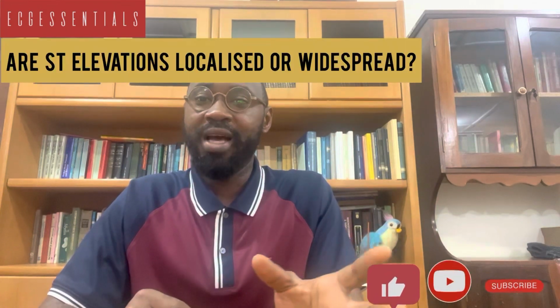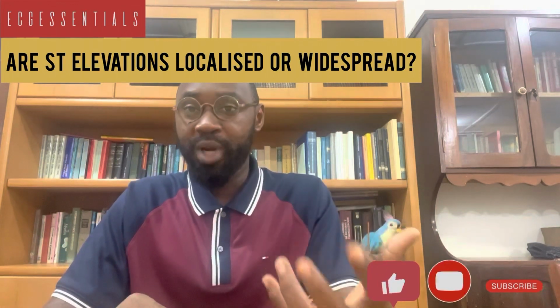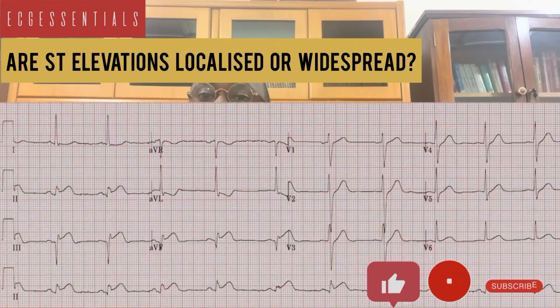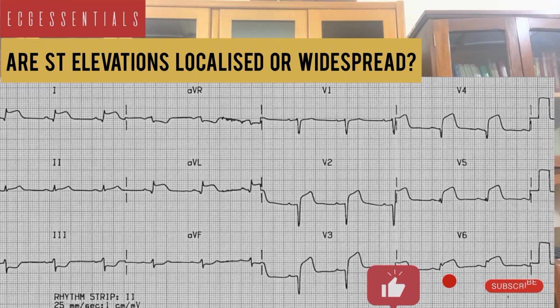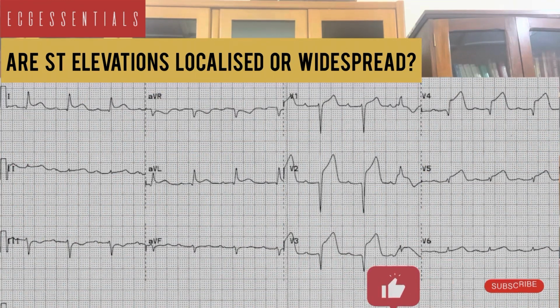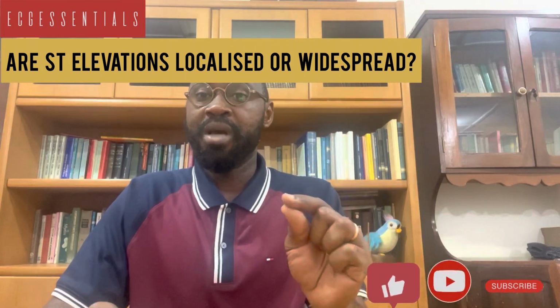All right. So we should also be looking out for whether the ST elevation is localized or is widespread. When I say localized, I'm referring to whether we find these ST elevations in the inferior leads, in the left lateral leads, or in the anterior or septal leads, because ST elevations representing myocardial infarction are likely to localize to one of these groups of leads.